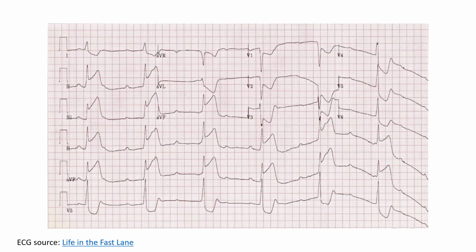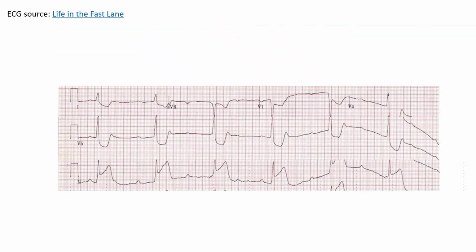Let's apply this by taking a look at this ECG. You don't need to be particularly systematic to notice a problem here. Start with the rhythm strip, first taking note of whether it's fast or slow. You can ballpark a speed by looking at the first 2.5 seconds. I can tell that it's somewhere between 24 and 48 because there are only 2 beats right there.